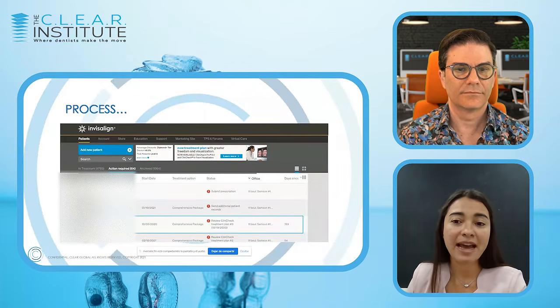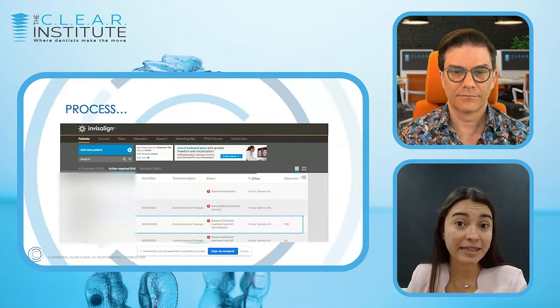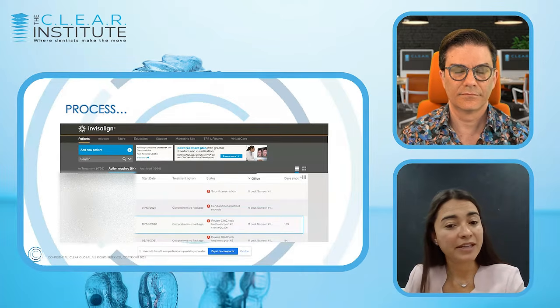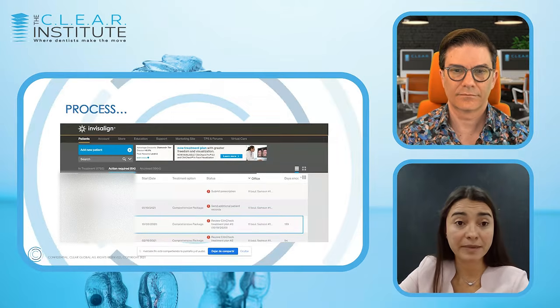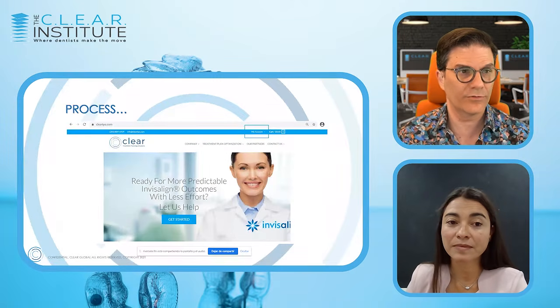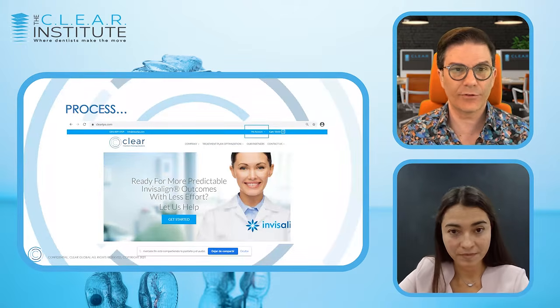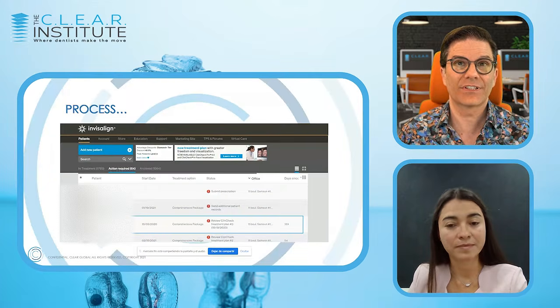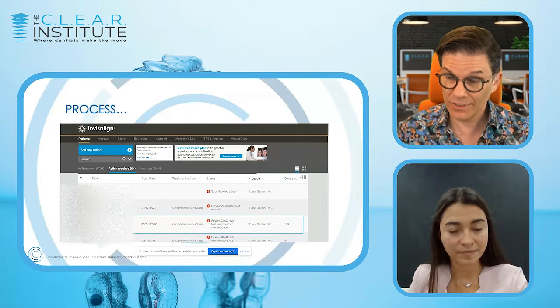The first thing you need to have is a case ready to be evaluated. This is an example of an Invisalign case, but it's no different from any other clear aligner software. So for this particular case, there needs to be already a setup created and ready to be evaluated. Then, so that means, Dr. Garro, that means really to make it clear for you doctors is that you need to fill a prescription, you need to send the first prescription. It can be brief, but you need to send something and have a first ClinCheck coming back to you before we send it to ClearTPS, right?